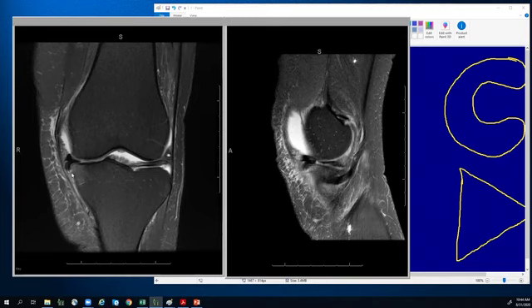These flap tears inevitably are associated with reactive marrow edema. In this case, we see the reactive marrow edema involving the medial tibial plateau here. If you had the meniscal apostrophe sign, then you also wind up with marrow edema involving the femoral condyle.